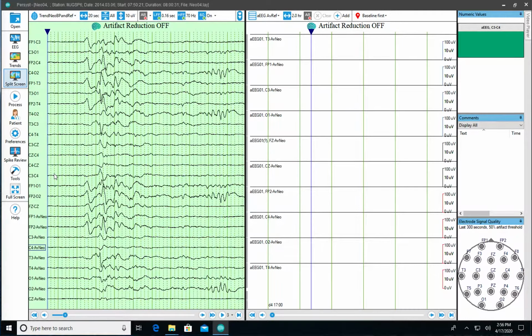And since we're not doing seizure detection or spike detection within this, we can add those additional channel sets. And if you're doing one or the other, you can switch between those. But we'll set the default to be the two-channel AEEG.